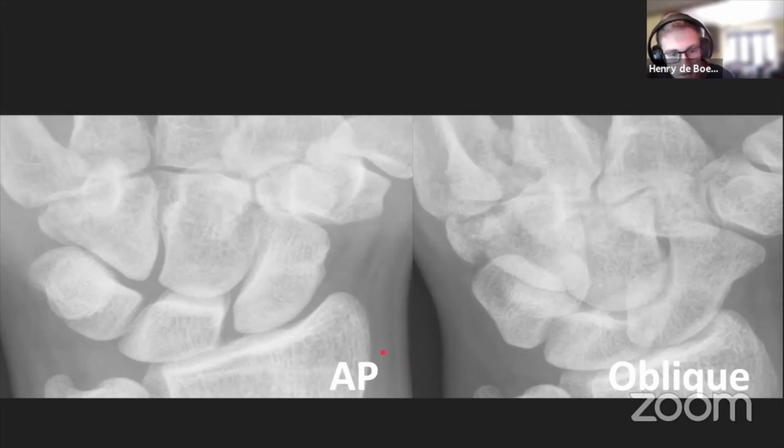Okay, so this one, tracing the carpal bones, and yes, well done to all of you who've spotted. Here is a hamate fracture, but let's make sure we look at the rest of the film. So the alignment, the carpal spaces look okay, and at the edge of the film, the base of the metacarpals look okay.